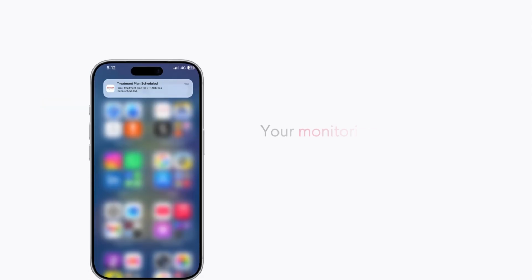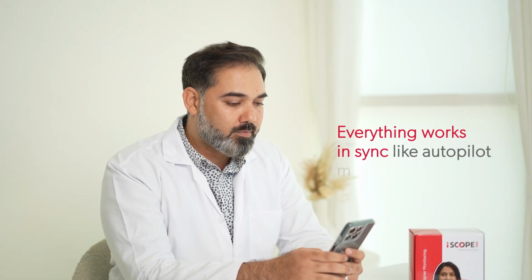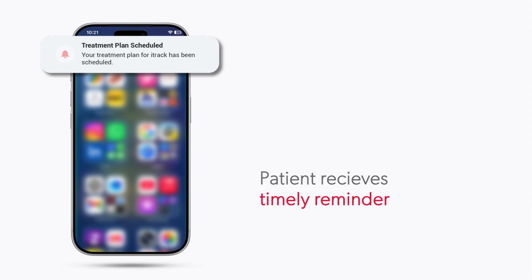The iTrack plan is now activated. The AI-powered system automatically creates a complete tracking schedule for the patient. From here, everything works in sync like autopilot mode. The patient will receive timely reminders on their phone based on the schedule.